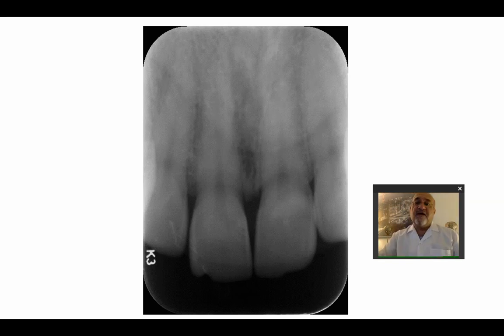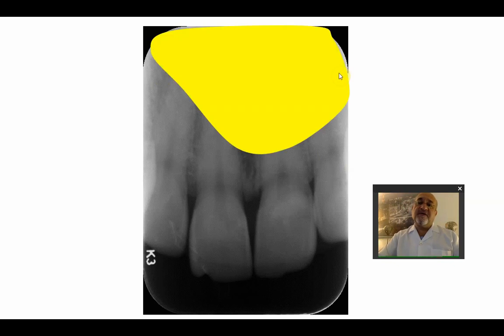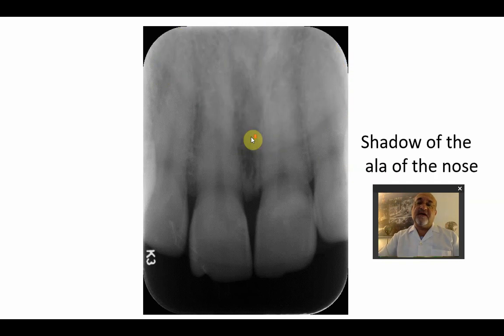So please, this is the shadow of the ala of the nose.